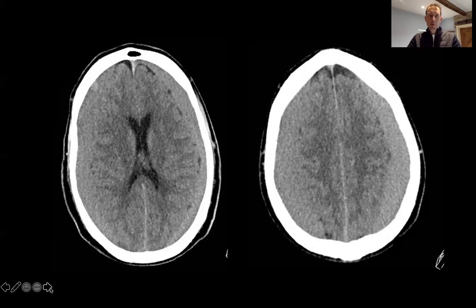Subdurals aren't usually difficult to spot. However, isodense subdurals can be, and here we've got subdurals that are pretty much the same density as the cortex. So this can occur in a couple of scenarios. One is if you're dealing with subacute or chronic subdural hemorrhages, so the blood products gradually lose density over several days, and become isodense to the brain. Alternatively, this could be a patient with a low hemoglobin. So patients with low hemoglobin can also present with isodense subdurals. So hemoglobin of 8 or 9 can give you this sort of pattern even in the acute phase.